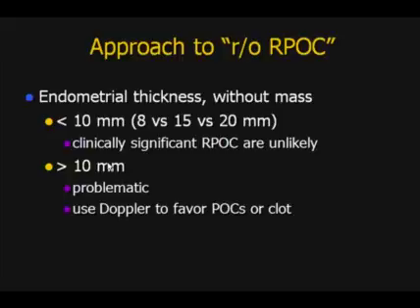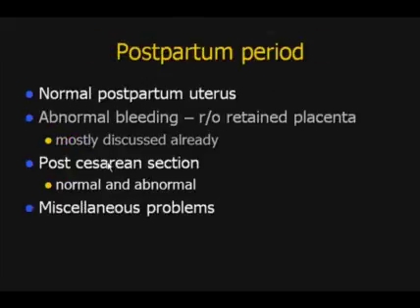If it's more than about 10 millimeters, then I think it's problematic. I would use color power Doppler to push me one way or the other, with flow favoring retained products, lack of flow favoring clot, but again, neither totally reliable.